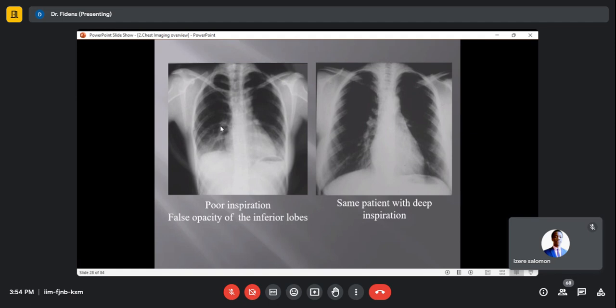So like this X-ray, normally if you check the penetration, the KVP is good because I can see the spine faintly, but the lungs are too dark, meaning they have sent a lot of X-rays. The power of X-ray production is good, the penetration is good, but the number of X-rays is too much. That's the reason why they made the lungs darker.